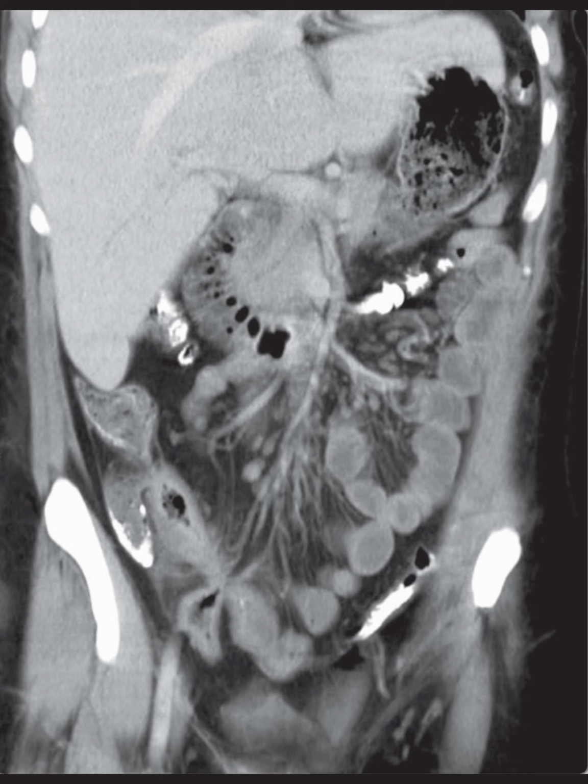These inflammatory changes make me think of Crohn's disease, especially with the involvement of the terminal ileum and signs pointing to an enteroenteric fistula between the distal small bowel loops. If the patient has a known history of inflammatory bowel disease, this diagnosis fits well. If not, I'd definitely communicate these findings to the gastroenterology team, who might consider endoscopy and biopsy for further evaluation.